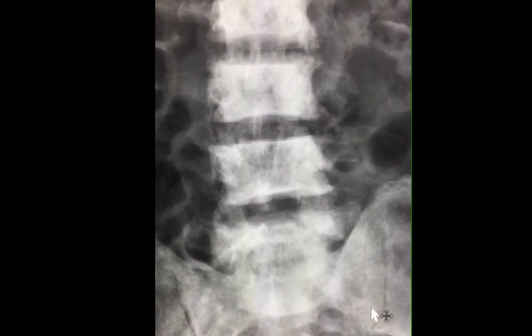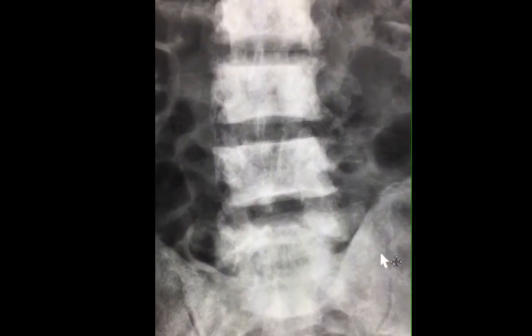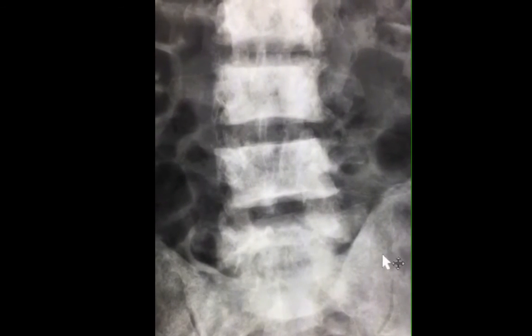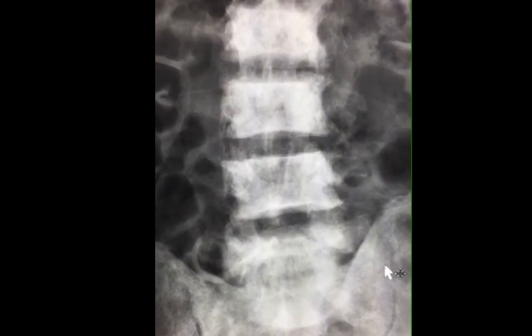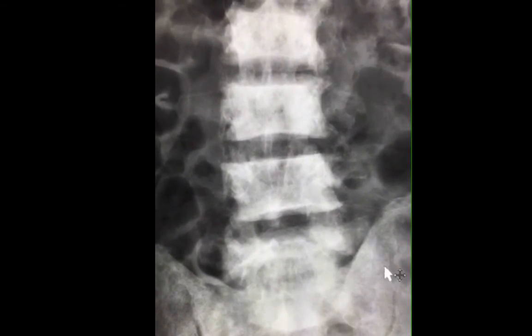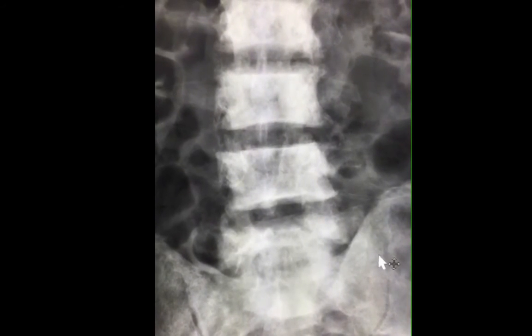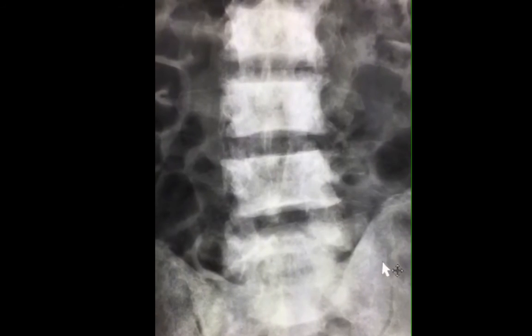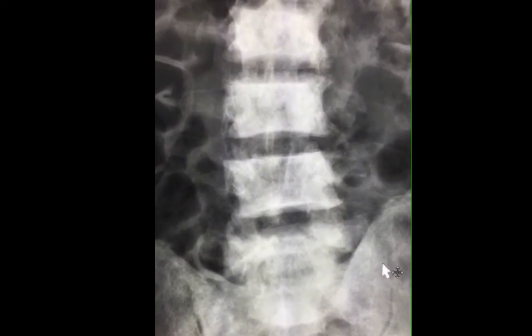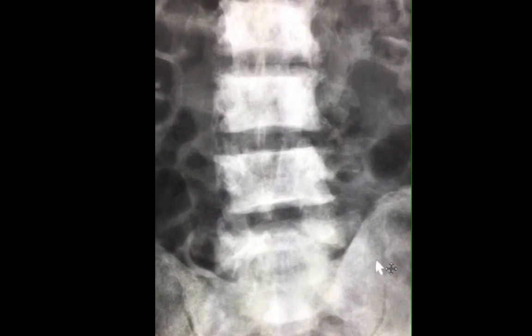Osteopoikilosis is a rare entity characterized by multiple tiny spots of increased density known as multiple bone islands. So we're left with common entities that could be characterized under either neoplastic, metabolic, or sickle cell disease changes. Although myeloma is a neoplastic entity that is common, it's usually associated with decreased rather than increased bone density. A very rare subset of myeloma may be associated with increased bone density.